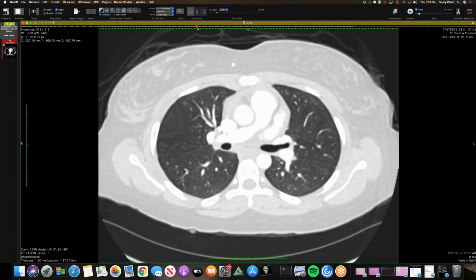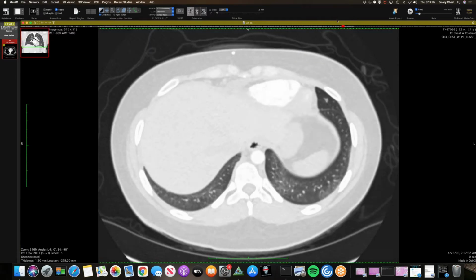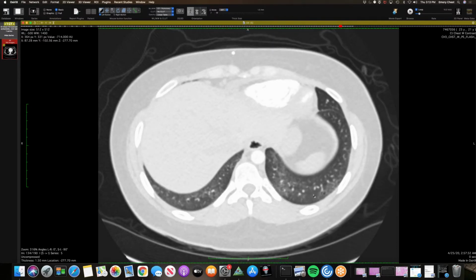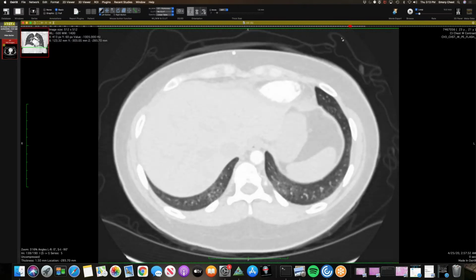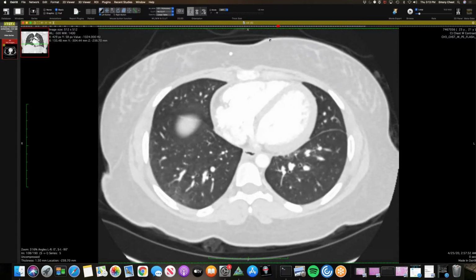This is a much more early case. This patient was younger, but you could see, and we see this a lot of the time, when I see something like this in a younger patient, immediately we think about, in Atlanta here, one of the things we think about is lupus. You'd see the ground glass here at the lung bases with some very small cystic changes.